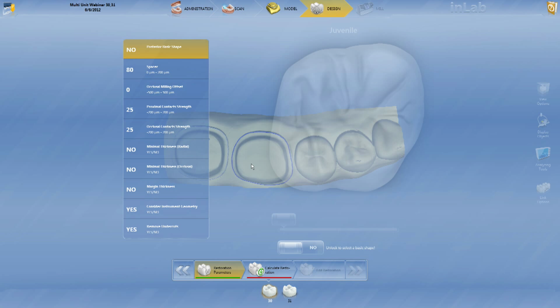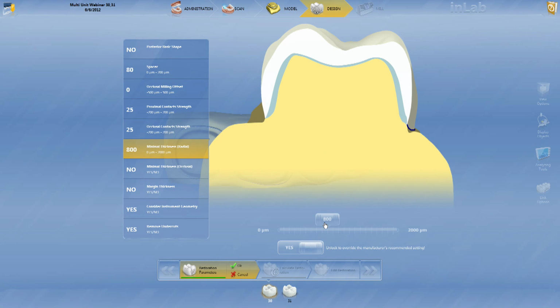So let's exit. Go back. We'll just play with our parameters a little bit.